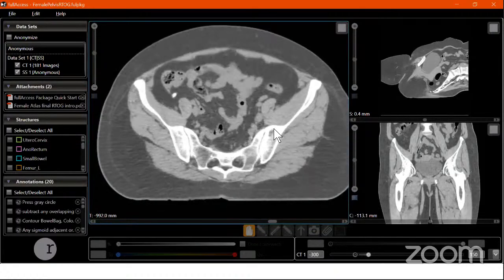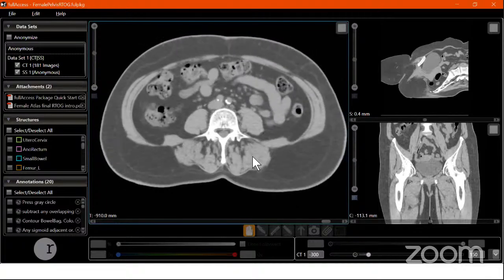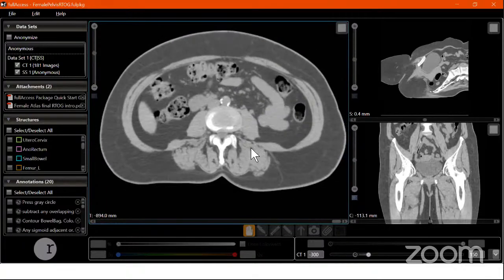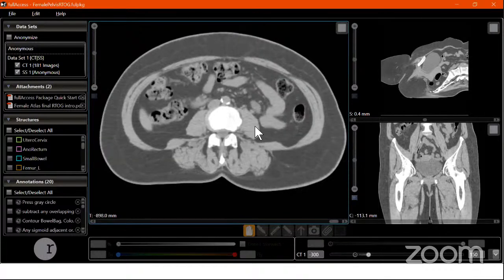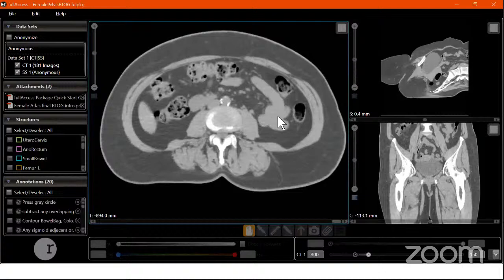So let us start. As I said, before starting the job of contouring, we do a preliminary scan to check all the diagnostic parts. This is a CT scan of a normal pelvis that has been downloaded from the RTOG website, so we are going to do contouring on a normal pelvis. I tried to use my own cases, but there is no good software that can represent it as easily as this one. So we'll try to identify the basics, and we'll go with this.